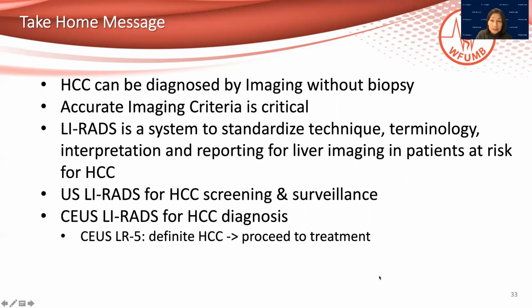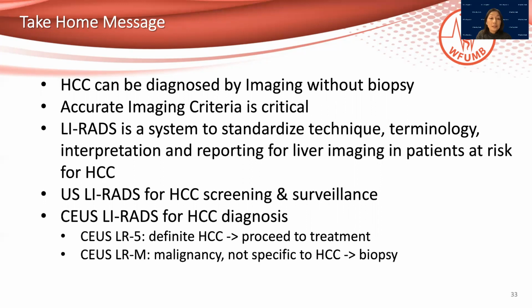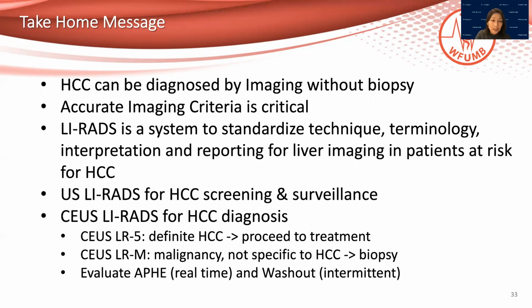CEUS LI-RADS 5 is definite HCC, so you can proceed to treatment. CEUS LI-RADS M is malignant but not specific to HCC, so you need to do a biopsy. You need to evaluate arterial phase enhancement in real time and washout in intermittent imaging. Washout timing and degree are very important to assess.